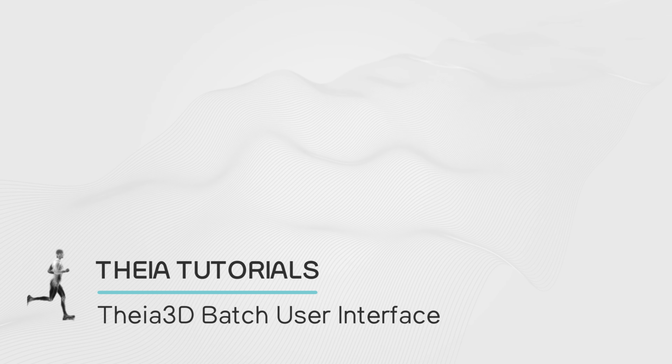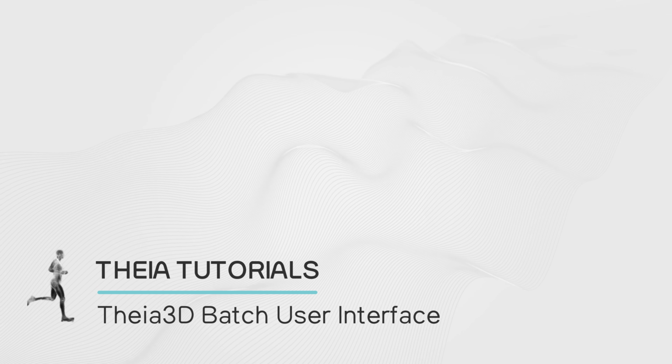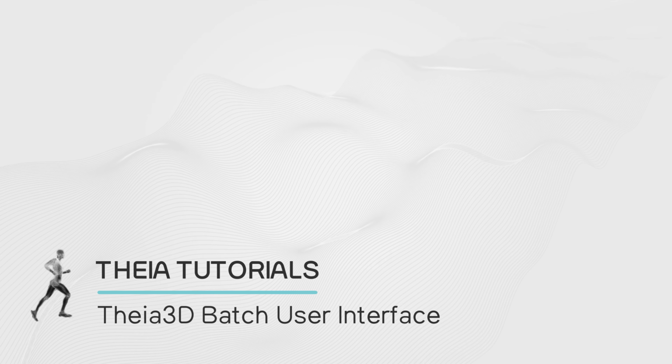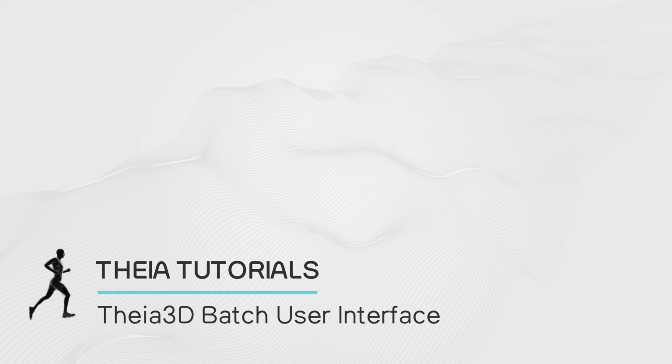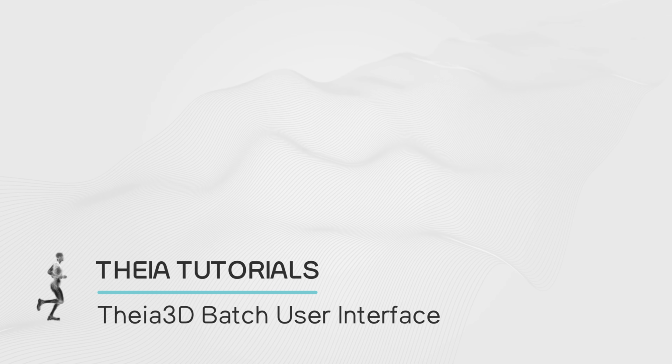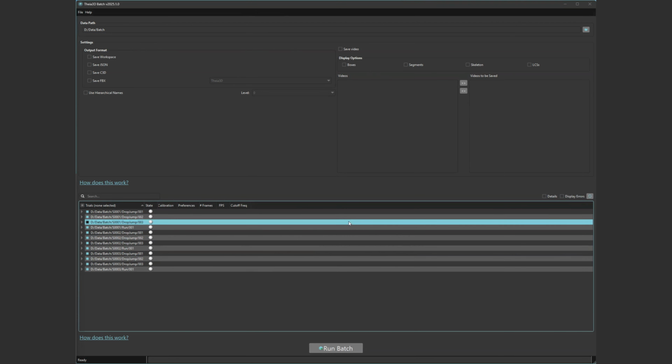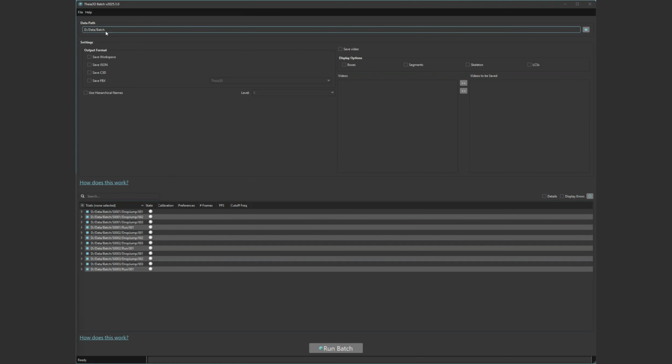In this video, we will describe the layout of the Theia3D Batch application user interface and where its functions are located. The Theia3D Batch application is made up of three main areas, which are the data path, the settings area, and the trial list. The data path displays the currently selected batch directory, where Theia3D Batch will look for the raw data to process. Next to the data path, the user can browse for a new batch directory.